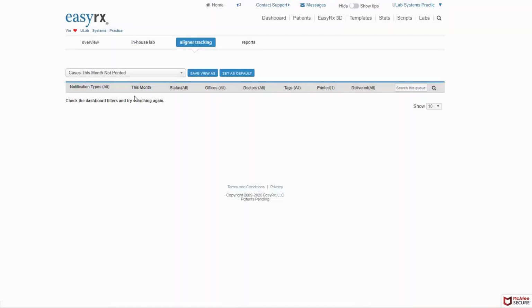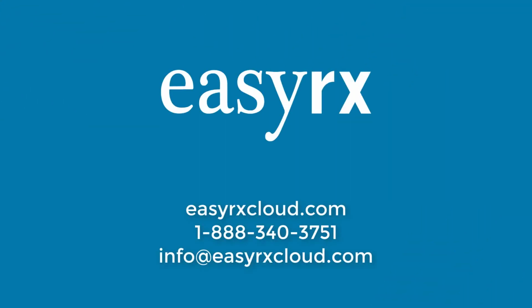And that's how EasyRx helps you submit, track, and manage your clear aligner cases. This is included in a premium subscription of EasyRx.